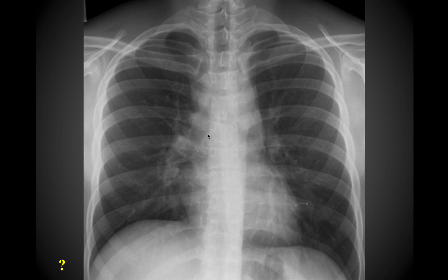Here's another chest x-ray. So again, you want to be looking to see if you see anything that is abnormal in this scan. And so at this point, the key here is that there's not a good AP window in this individual like you would normally expect. You don't really see a good aortic knob and then the left pulmonary artery like you'd expect to see with that AP window in between. But again, it's not easy to appreciate on this chest x-ray.